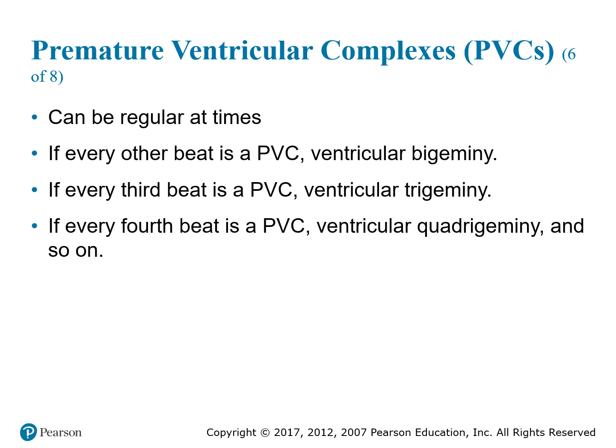PVCs can be regular at times. If for every other beat you see a PVC, we usually call that a ventricular bigeminy, meaning two. So you would have a beat, a PVC, a beat, a PVC. Every other beat would show a PVC in it.